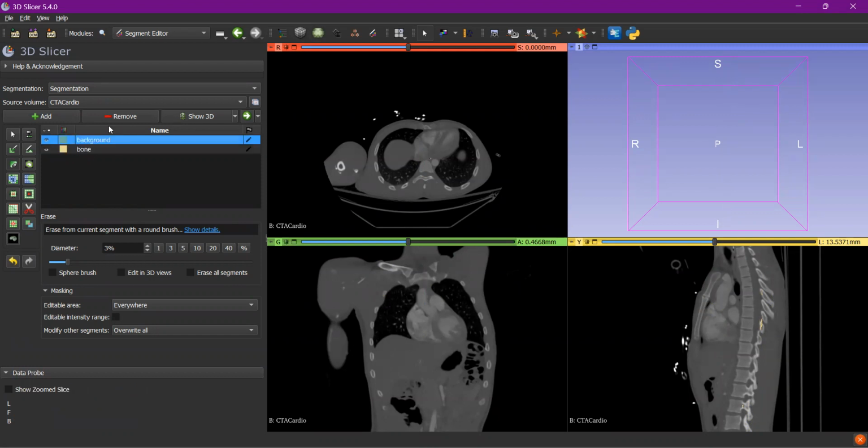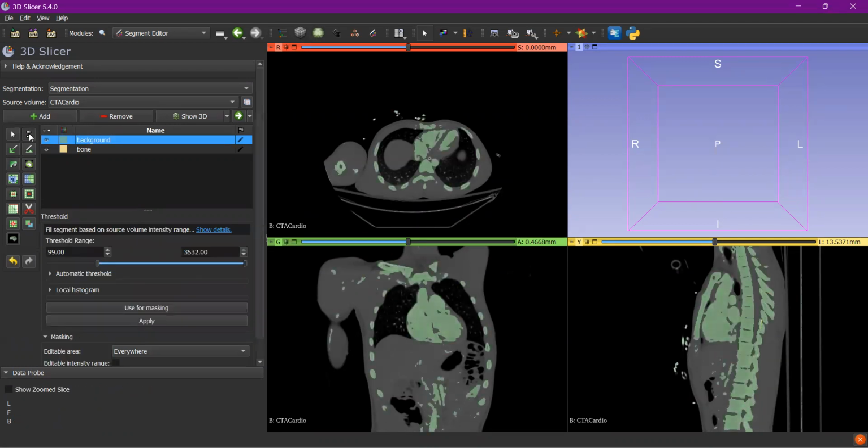I'm going for the background and I'm choosing threshold-based segmentation. Threshold-based means the intensity will be between the minimum and maximum values shown, on some different scale. I can choose the minimum and maximum as I wish, and it will change based upon the threshold region I have chosen.